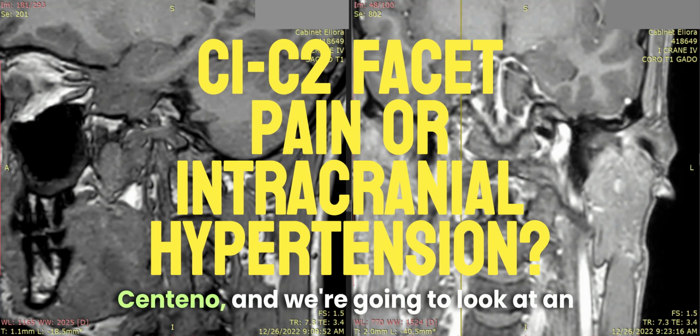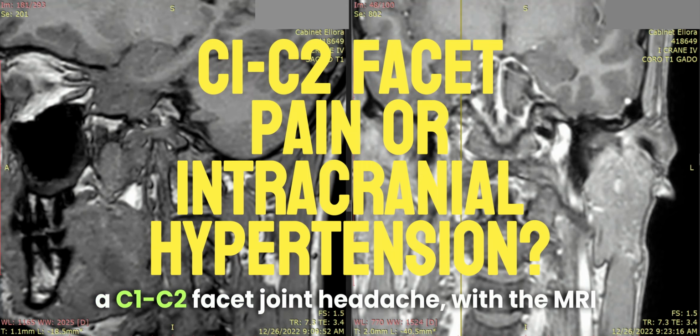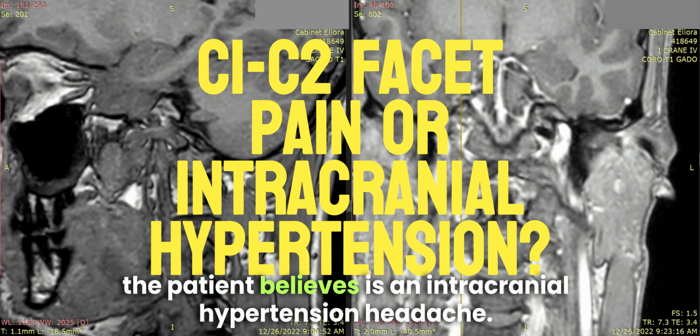Hey, this is Dr. Centeno, and we're going to look at an interesting case today of what I believe is a C1-C2 facet joint headache, with the MRI evidence showing that that's the case, versus what the patient believes is an intracranial hypertension headache.